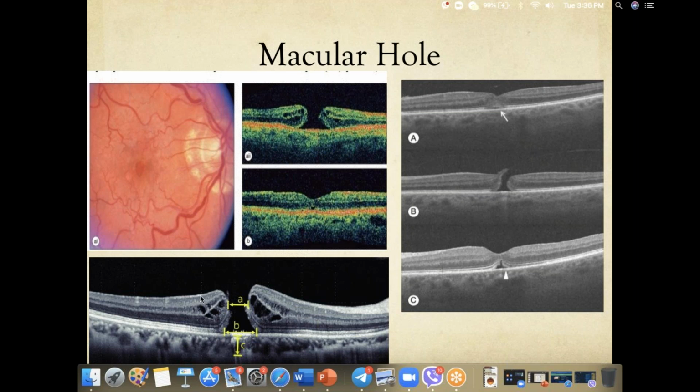So if I were to do a surgery in this macular hole, what I would say is the surgery would be quite good since the hole is not huge, but vision recovery would be quite poor because the rods and cones are disturbed. The ISOS junction is preserved. Over here, you cannot see the ISOS junction, but as you see, it has bent upwards. So it's preserved, because once it comes down, it'll create a communication.